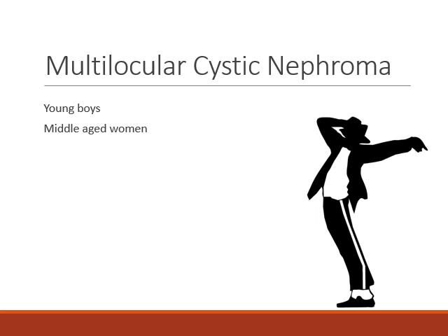It's actually a spectrum of lesions. Some people think that both cystic nephroma and MEST that we just talked about are on the same spectrum of disease. Again, you have this multiloculated cystic mass with enhancing septae. Again, they tend to herniate into the renal pelvis or the proximal ureter. A clue to cystic nephroma, in addition to the demographics, is that the septae are fibrous, and so the septations will be low signal on T1 and T2 imaging. But again, like with MEST, we can't be sure, so we tend to surgically resect these also.